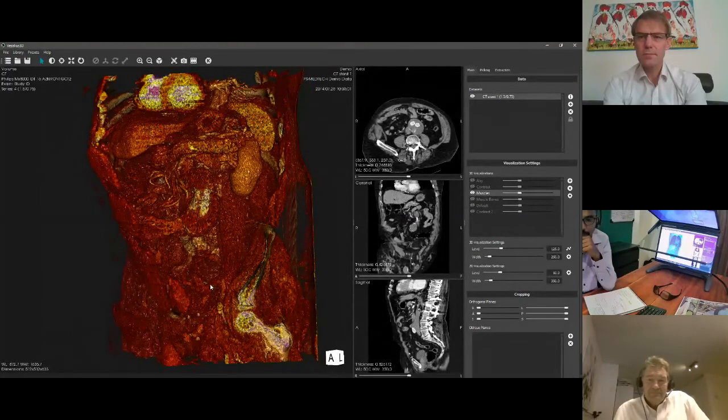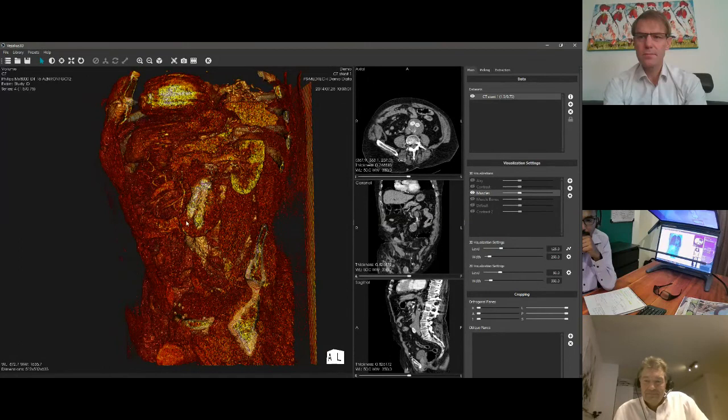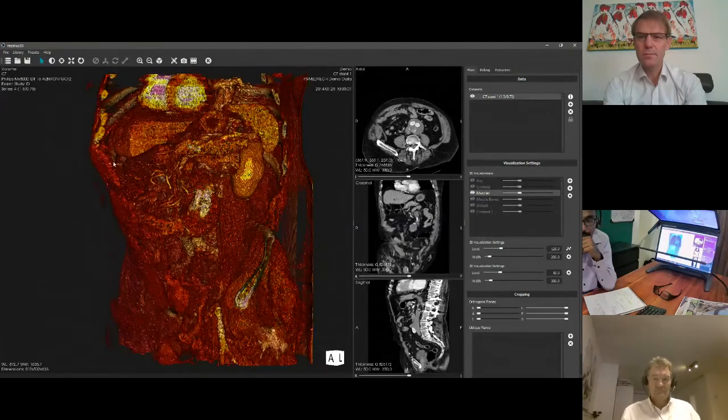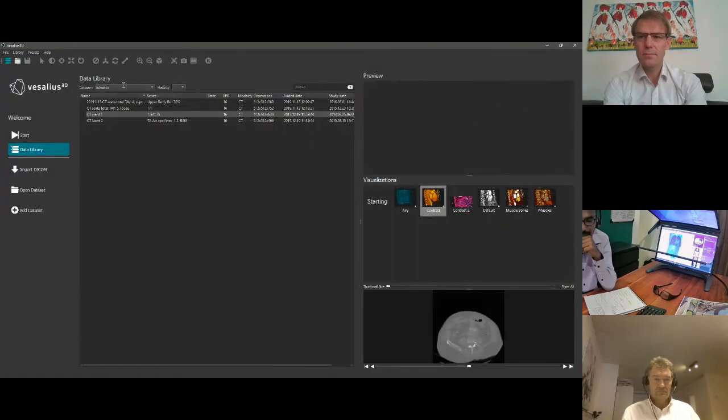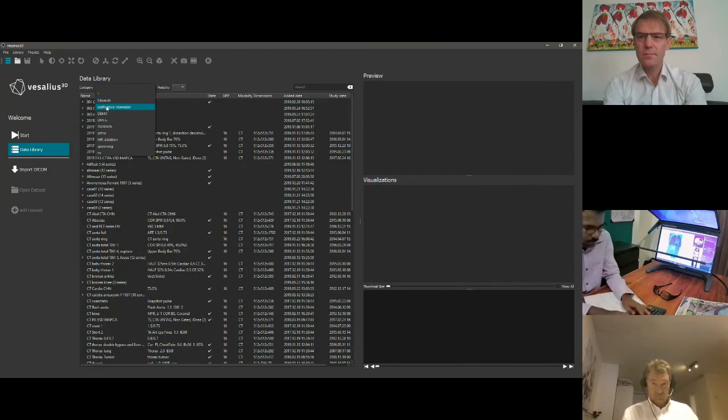I would love to open up now a scan of another part, and you can see here where the big problem area used to be. But now I'm going to open a data set that is really interesting. I think it is a data set where there is a coarctatio, and it's a huge one.